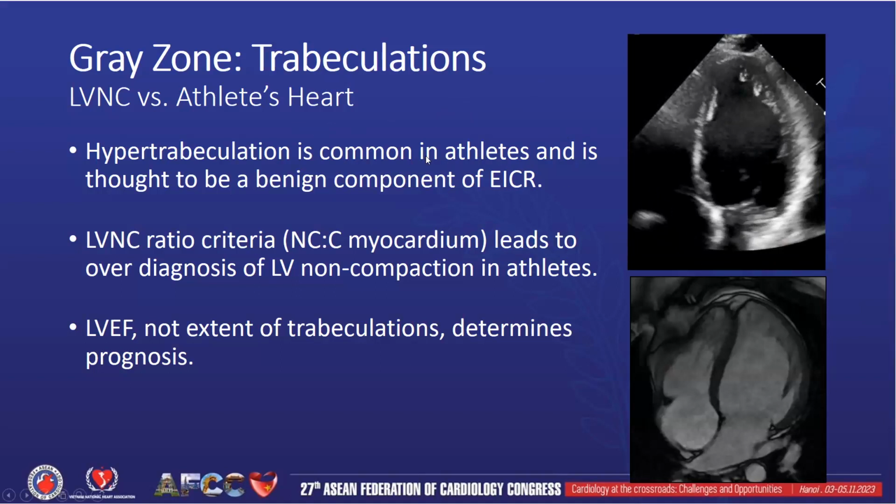So when we rely solely on the left ventricular non-compaction ratio criteria, that is the ratio of non-compacted to compacted myocardium, this can easily lead to the overdiagnosis of left ventricular non-compaction in athletes. And so we have to be careful about this diagnosis. And it's not one that I will give to an individual if they have normal ejection fraction.